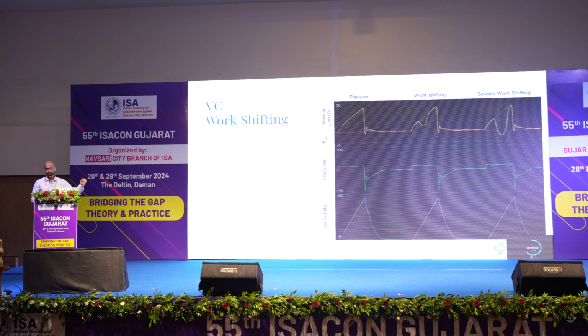Similarly, when you are in volume control, work shifting is noted not on the flow time but on the pressure time. So just train yourself. If you are in a pressure control mode, look at flow time. If you are in a volume control mode, look at pressure time.